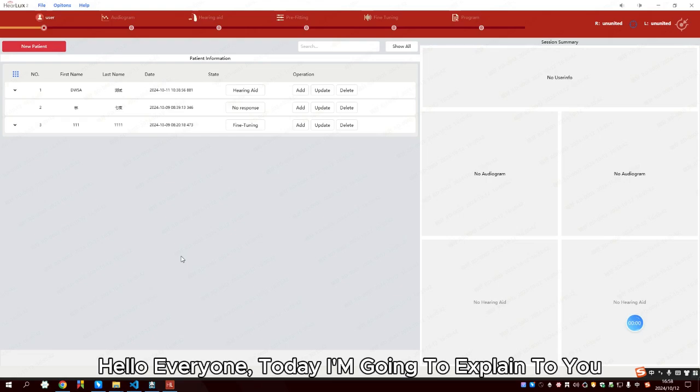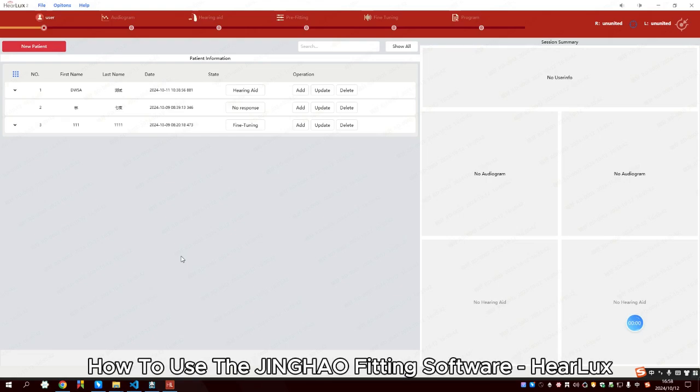Hello everyone, today I'm going to explain how to use the Jinghao fitting software, HearLux.